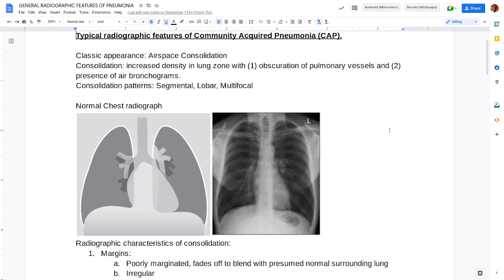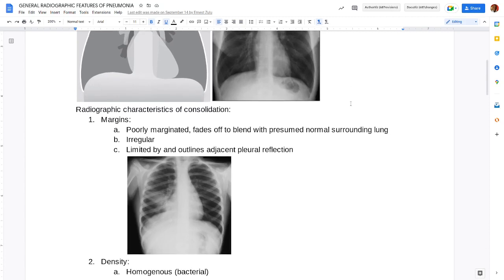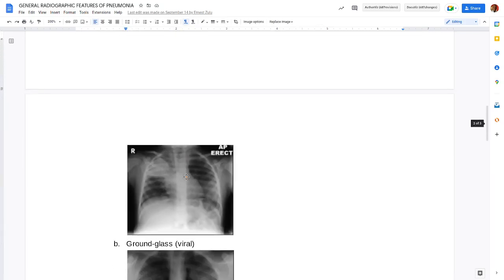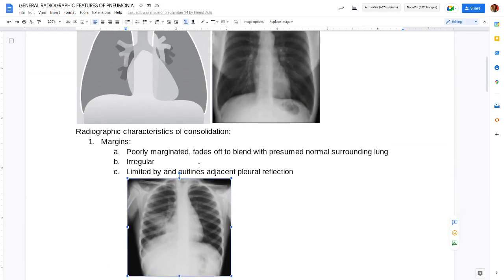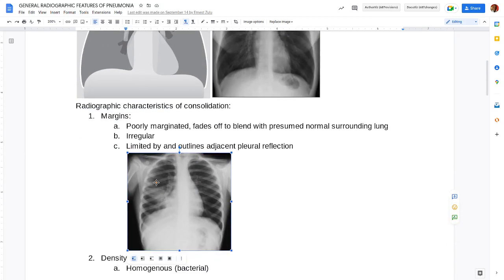I think for me it would make a lot more sense if I can scroll down to the abnormal one so that I see. So look at that X-ray, the next X-ray. This one is the abnormal one, right? Which area do you think is abnormal on that X-ray? Oh, clearly to my left here, this side here.